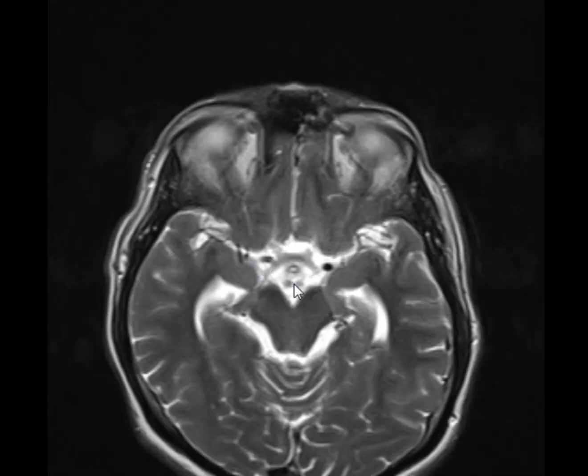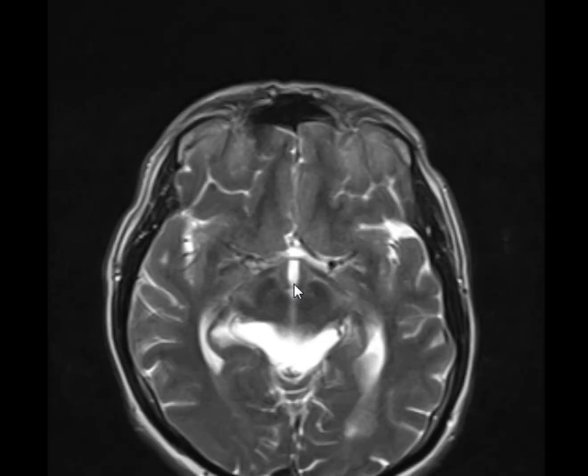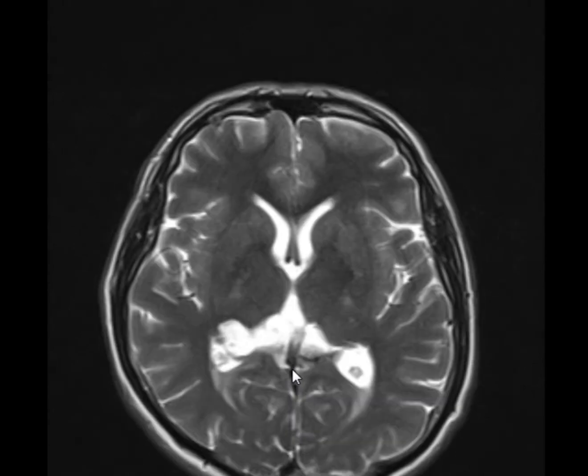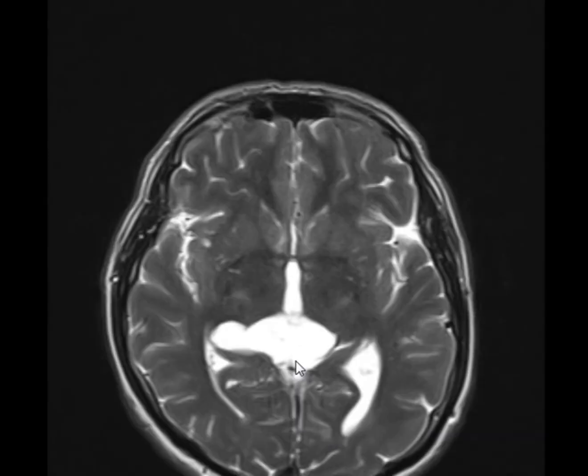How does the carotid artery appear? Wait. Is this normal? Dilated third ventricle. Where is the third ventricle? Sorry, it's between the thalami. Is the third ventricle dilated? Yes, mild dilation. Okay, no problem. What else? Come on, are you kidding me? It appears cystic. It's a lesion there. Yes, a big lesion. You can see all of this.